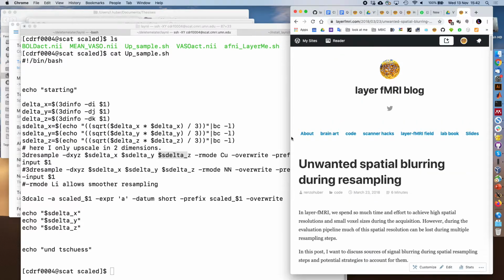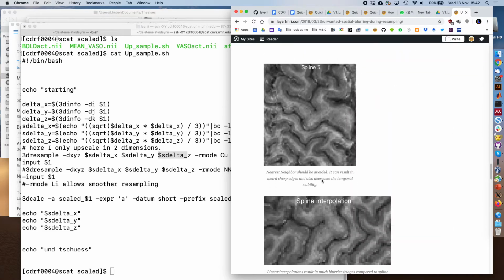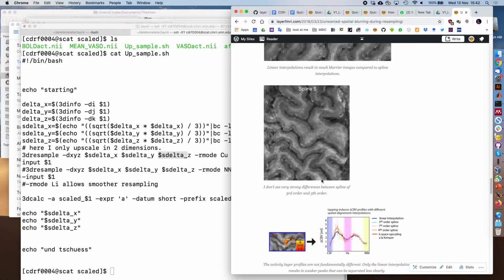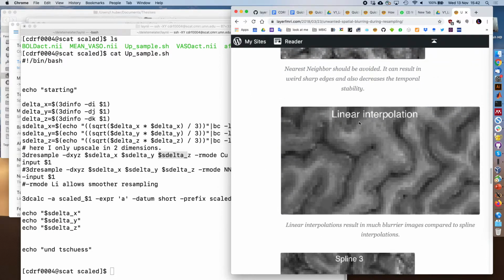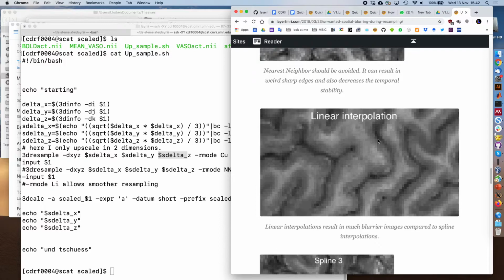So there are maybe similar things like spin echo and gradient echo, and so there's no final perfect way on how to do things. It's like comparing bicycles with planes. When I do a linear interpolation or spline interpolation, the linear looks smoother. I don't want that. The spline looks noisier, and it might be because it amplifies noise, or it might be because it doesn't smooth data.